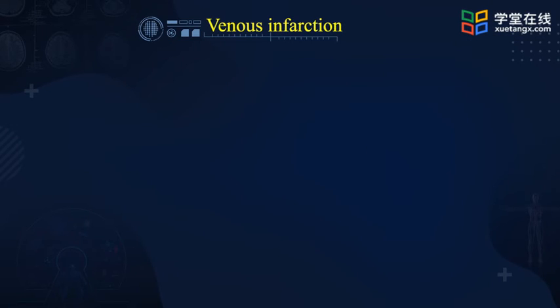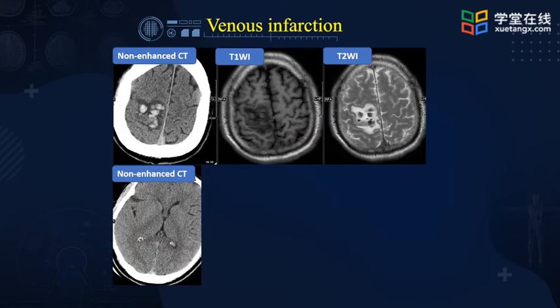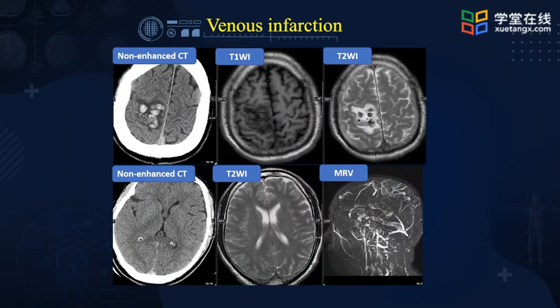The most frequently thrombosed venous structure is the superior sagittal sinus. Infarction is seen in 75% of cases. The abnormalities are parasagittal and frequently bilateral. Hemorrhage is seen in 60% of the cases. These images show right frontal and parietal lobe hemorrhagic infarction due to superior sagittal sinus thrombosis.